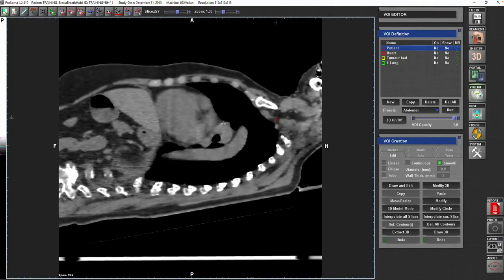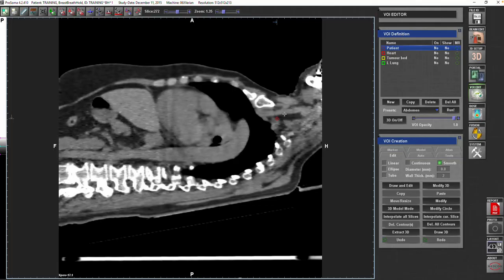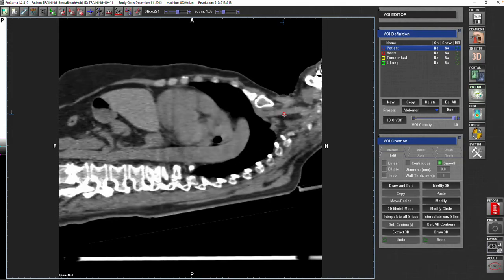If you look at the sagittal view, this may explain it a bit. If I put the crosshair here and give you a second point somewhere here, because of the sloping nature of our chest wall and neck, this point is cranial, but at the same time it's posterior to the vein, or posterior to the sternum.